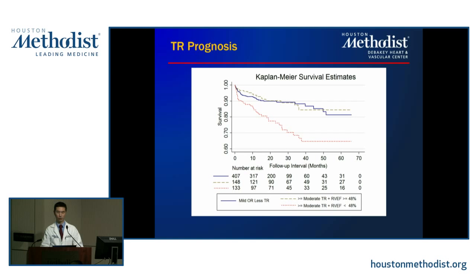Congenital abnormalities also come through. This is a patient I actually saw in clinic, who had repaired tetralogy of Fallot by Dr. Cooley next door, and she came in with some dizziness. One thing you'll appreciate is on the RV three-chamber view, there's actually signal dephasing in diastole, both in the RVOT view and RV three-chamber view, indicating significant pulmonary regurgitation. This was quantified as moderate to severe.